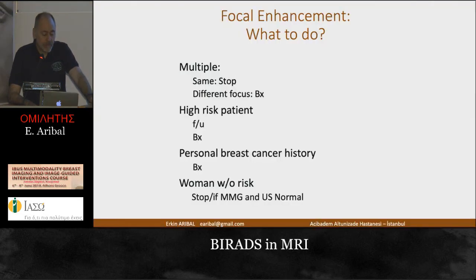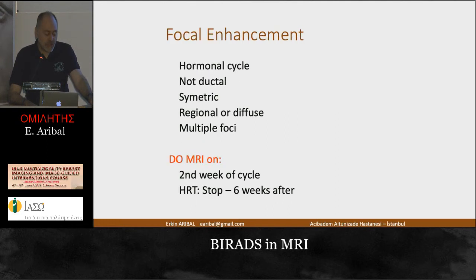So what do we do for focal enhancement? If there are multiple, stop, but if there is a different focus like the one I showed you, you should do the biopsy or be very careful about it. With high-risk patients, you may do the biopsy. With personal cancer history, you may do the biopsy. And if the woman is without risk, if the mammogram and ultrasound are normal, you can stop. So mammogram and ultrasound are important because you may have some findings corresponding to this MR finding, and that will help you in making a decision.